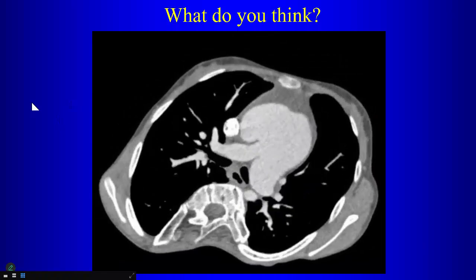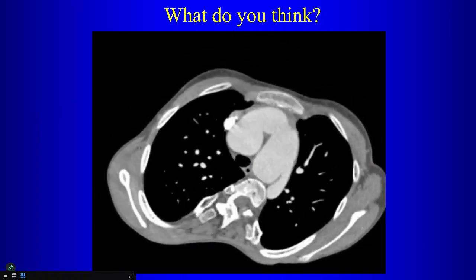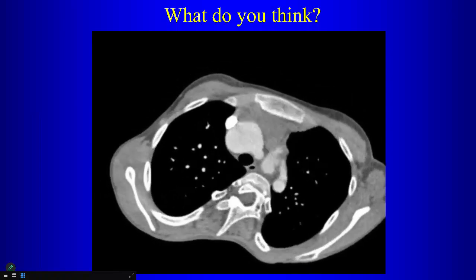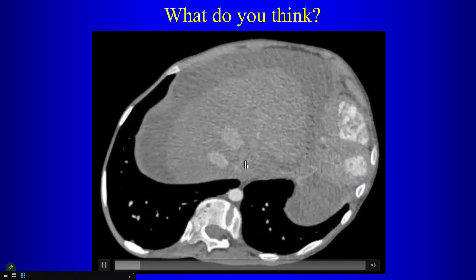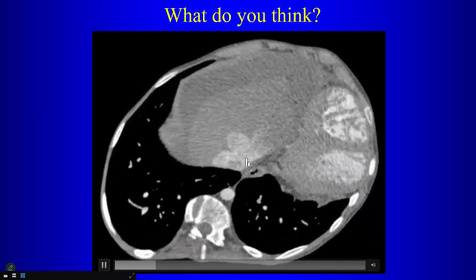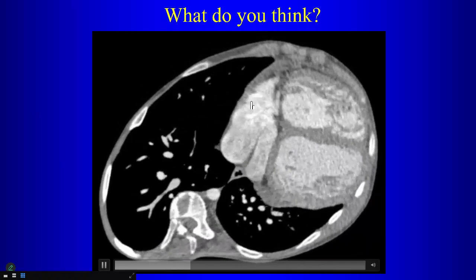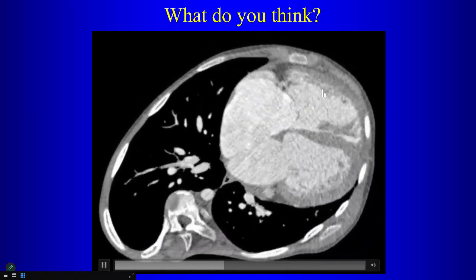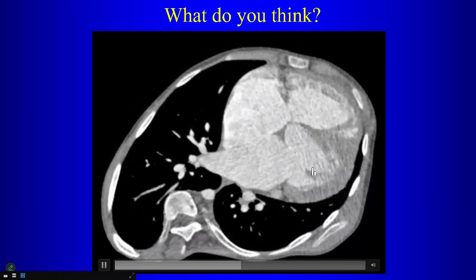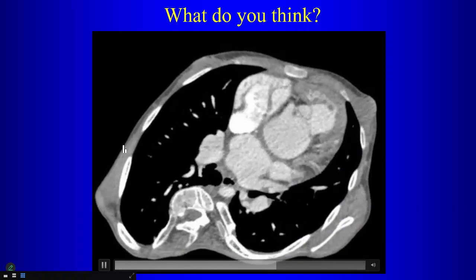And so now when we go through it again, we have to see, what do those chambers connect to? What do the right atrium and the right ventricle connect to? As you go through it again, here's the right atrium, and it connects to this guy, which is RV, right ventricle, so this guy will be LV, and you also notice that there's a VSD there.